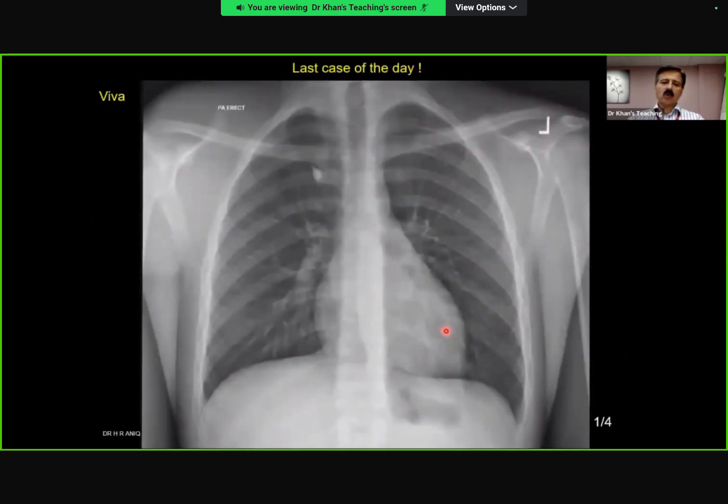Last case of the day. And this is a beautiful film for the same reason. It's an observational film, classical 2B. 466 people are still with us. If all of you can concentrate on this.